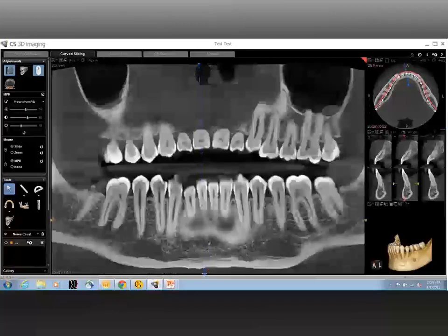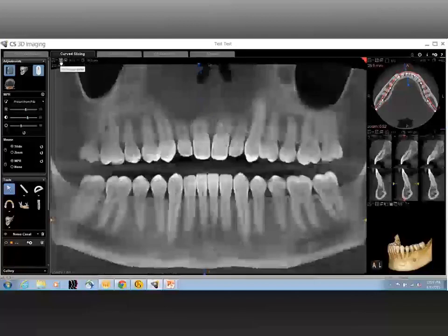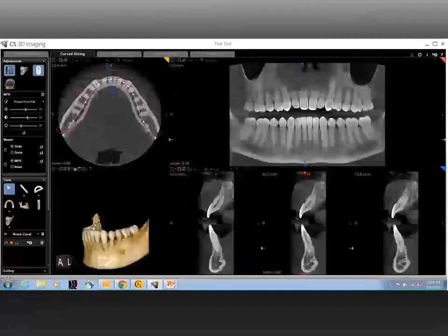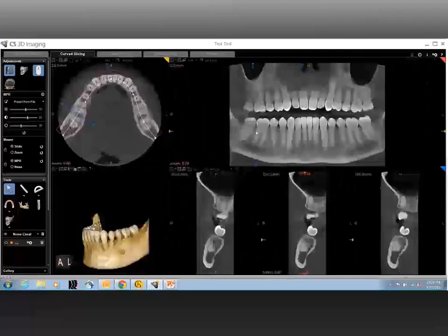So the inferior alveolar nerve, the mandibular foramen, and the lingual foramen. What are the important features of the mandible to be evaluated while planning for implant surgery? That is a very good question, Jordan. Your question actually leads to one of the most important things, that when we analyze any kind of anatomy, it may not be just limited to the critical structures. There might be a few other things that can potentially give you an idea about how the surgery has to move.